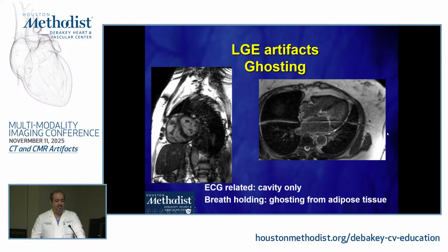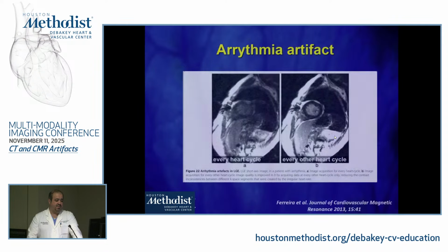But once the patient does not hold his breath, you're going to see this ghosting artifact going across the adipose tissue. So here it goes across the lung, here it goes across the adipose tissue, so you know that this is more likely to be a ghosting artifact from here to here and not related to an underlying gadolinium uptake.